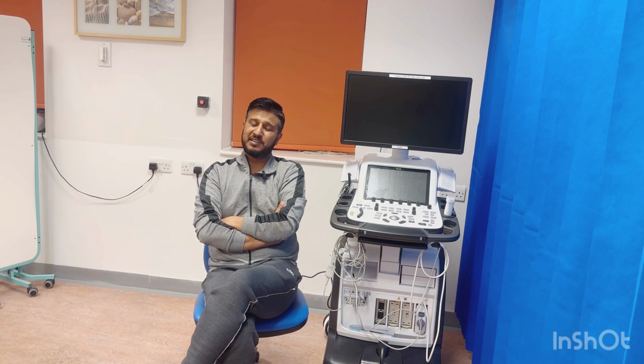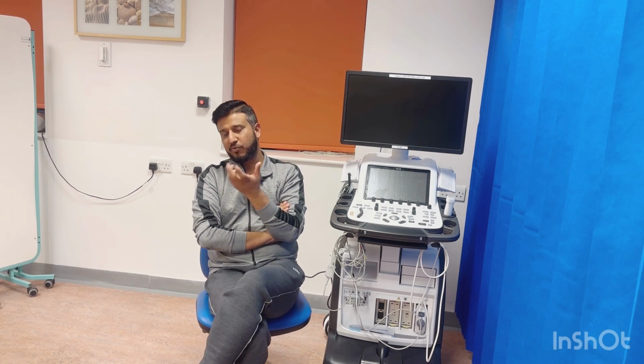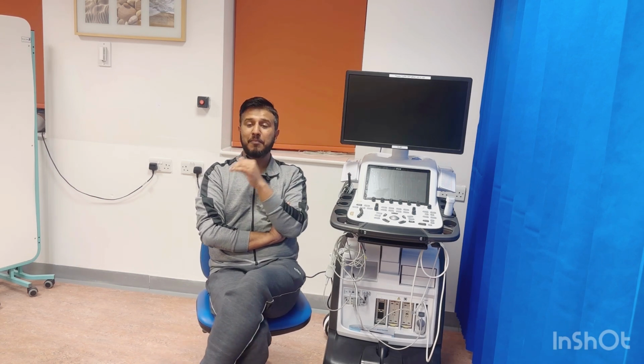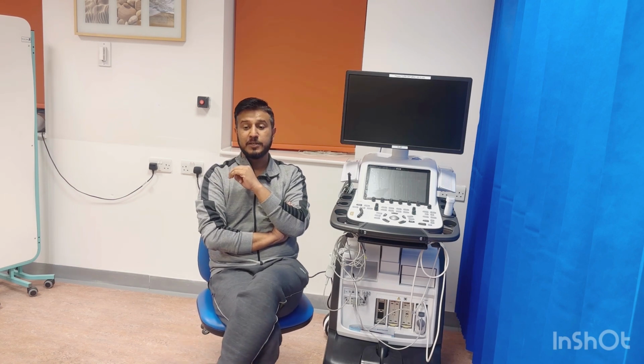If there are multiple jets, then you don't need to do vena contracta. Or if you just want to get a hint for yourself, just get the vena contracta of the bigger jet, just to make up your mind, but don't document it, as it's not reliable in those patients.